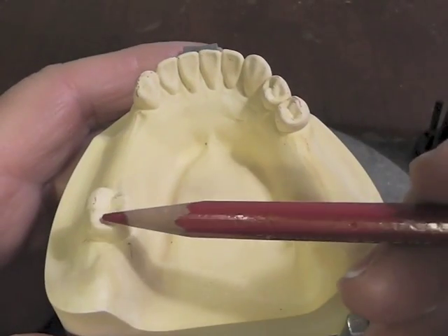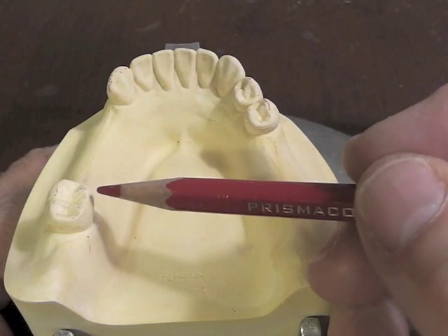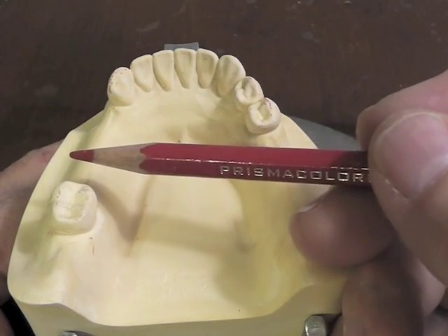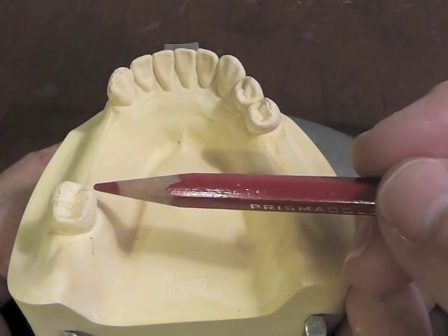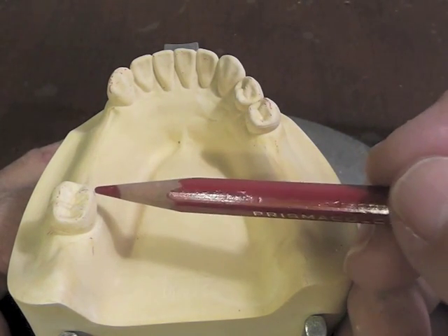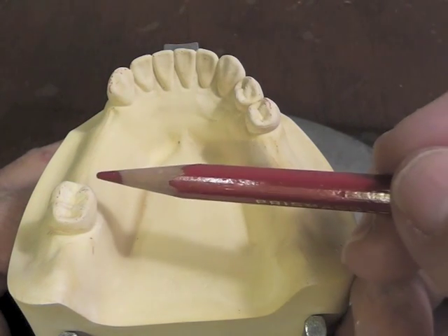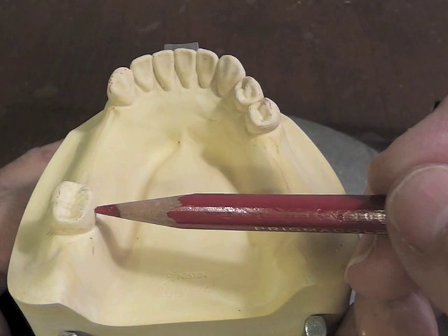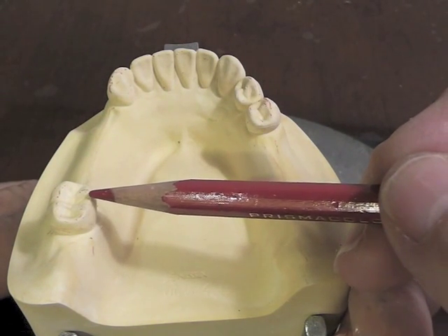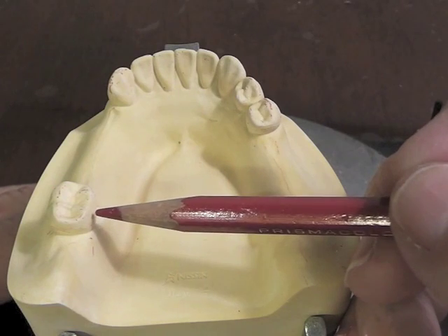On our mandibular tooth, it'll depend on where our undercuts are, but just looking at this, I would think we are going to want to grab an undercut, and the deepest undercut is going to be on this mesial lingual, because this tooth is leaning to the mesial, leaning to the lingual. And if we wanted to clasp, say, back here, because of the extreme lean of this tooth in this area, remember when we do a cast circumferential clasp and bring it to the distal lingual, we have to have the first 2/3 of it above the survey line. So this tooth would have to be ground on quite a bit in order to provide a survey line, possibly, that is down low enough so that the first 2/3 of that clasp arm can be above survey line.